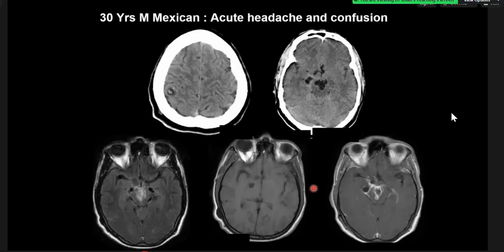Yeah. So I mean, there are different stages of neurocysticercosis. So what is this stage? You convince me. What is this stage and what is this stage? Tell me more. So on the top one, without enhancement, there's a calcification. So I believe that's vascular. This is not calcification. This was not calcification. Let me correct you. So then how do you explain this?